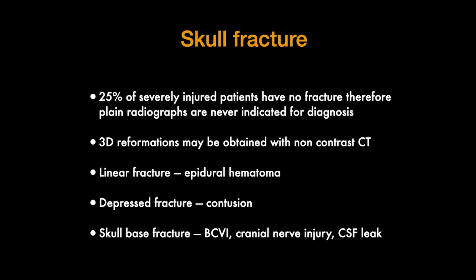So scalp contusions should be obvious. That's the first thing to look for. It tells you where to look for other underlying injuries. But skull fractures are the next layer in. And 25% of severely injured patients will have no skull fracture. Therefore, plain radiographs are never indicated for diagnosis and have not really been done routinely for many, many years.